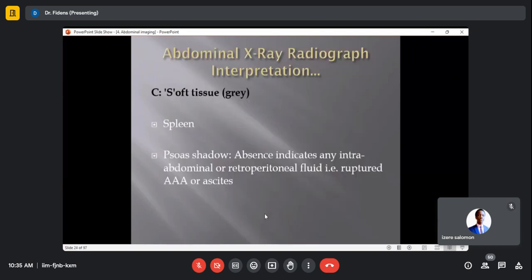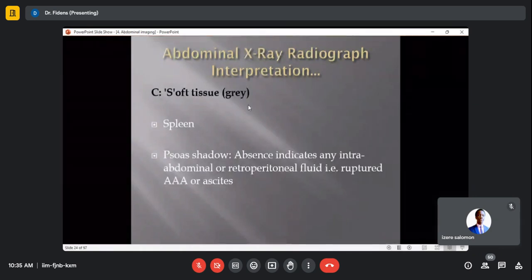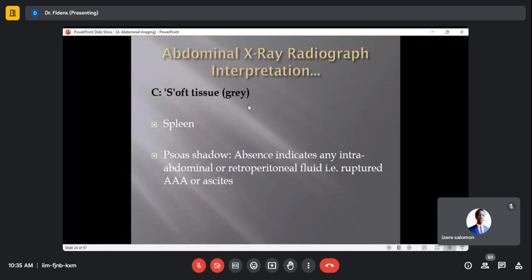And now it's for soft tissues. You remember it's about A, B, C, S. It is very easy. A for adequacy, alignment, and apparatus. B, bones and calcifications. C is for cartilage and joints. And S is for soft tissues. Soft tissues, remember what you have seen.